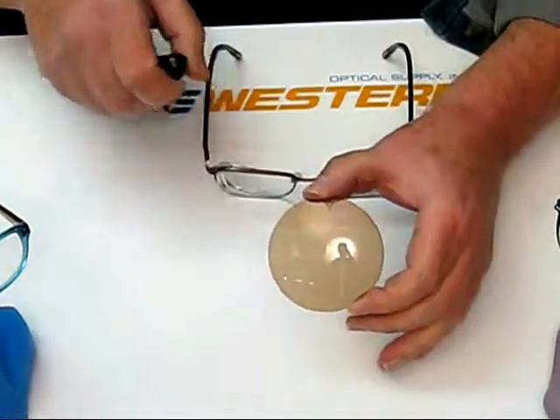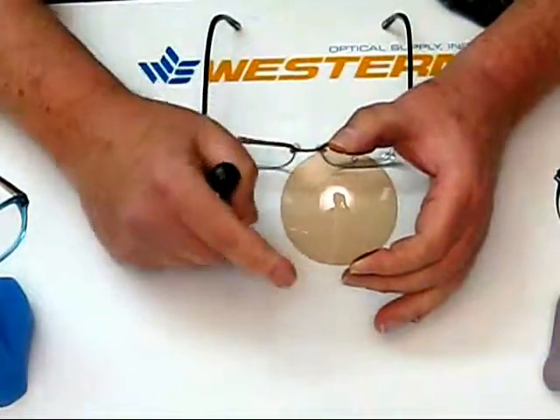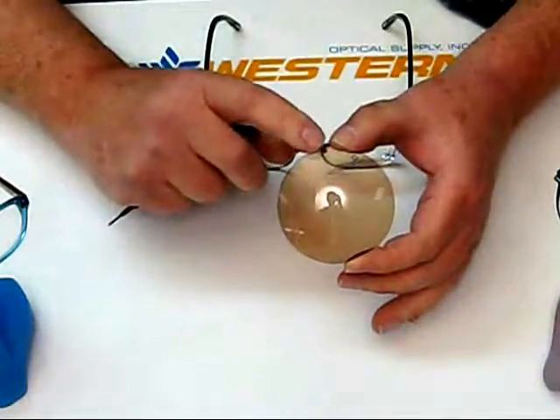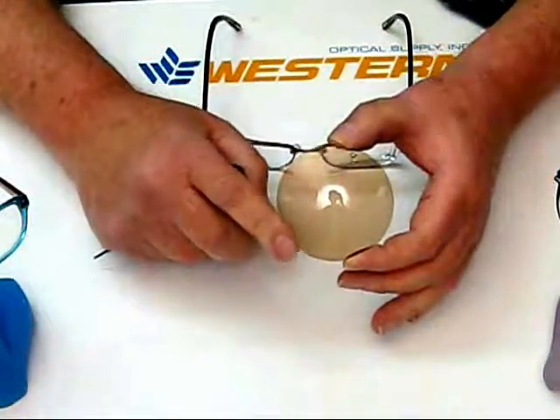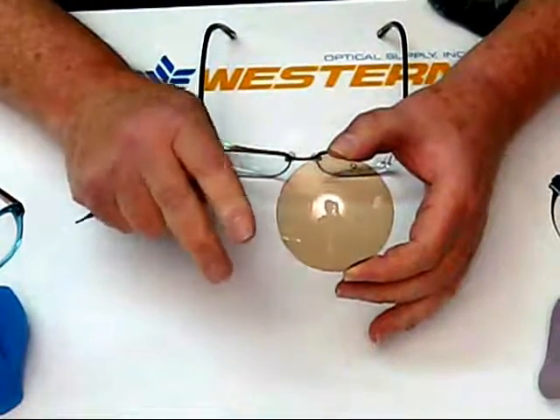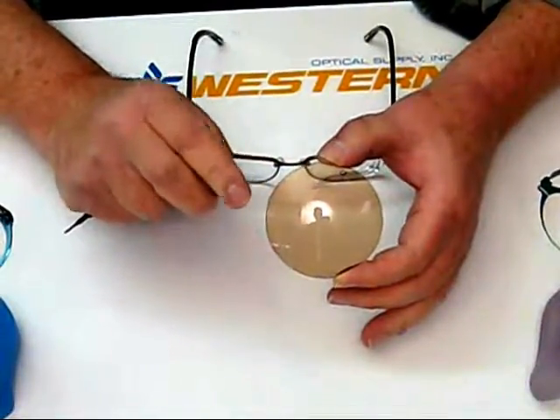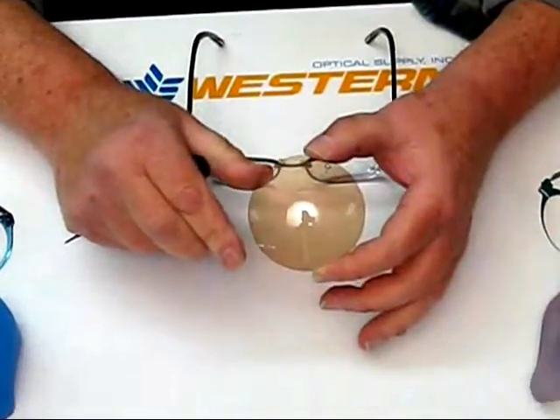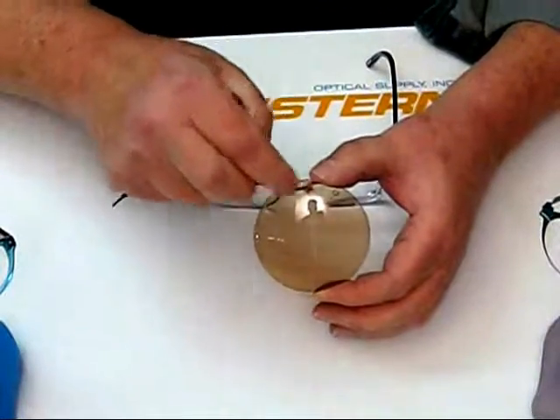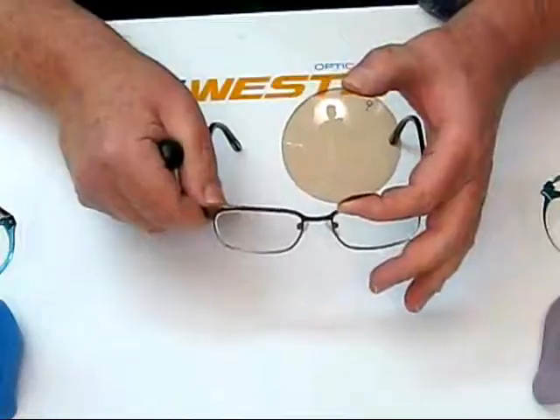The other aspect has to do with lenses. We have a front curve of a lens and a rear curve, a backside curve of the lens. And the angle of the curvature between the front and the back, as that differentiates, steeper in the front, less steep in the back, or any number of variations, determines the prescription or the power of that lens. Ultimately, this lens blank is going to be cut down to the proper shape to fit inside the eye wire.